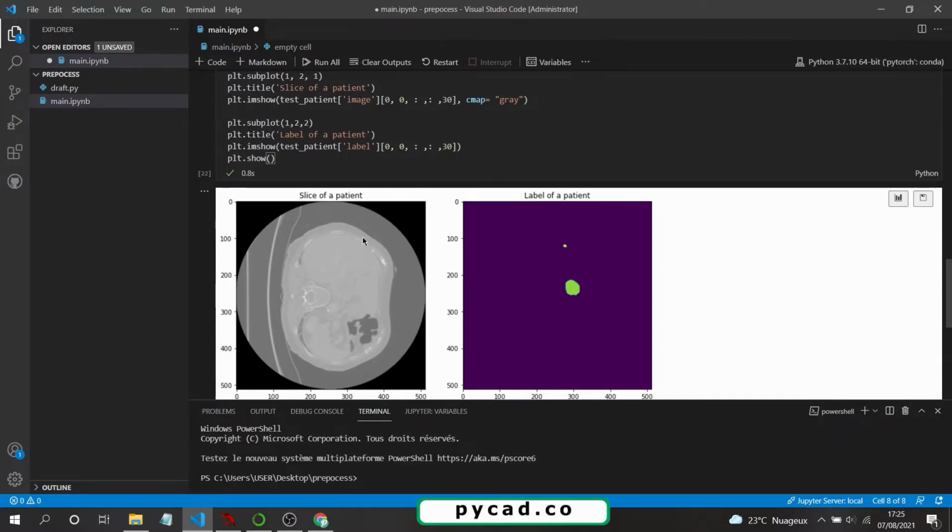If we have multiple dimensions of images, we always resize them into one unique dimension for the model, either in training or in testing. In 2D images we always do this resize, and the same thing applies here in medical images. We always need to do this pixel or voxel normalization, so we give one specific dimension for all the voxels that we get in the input.